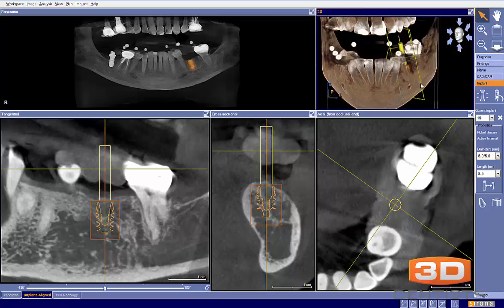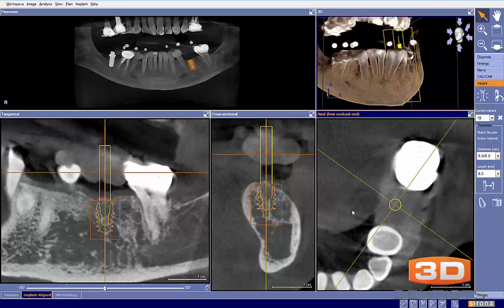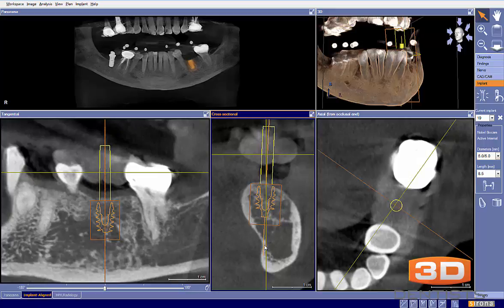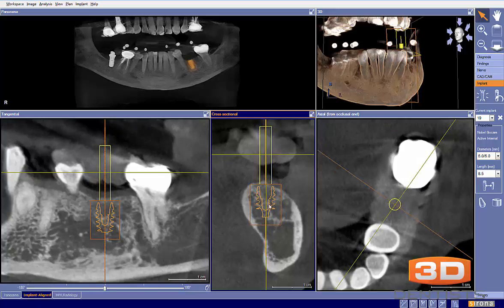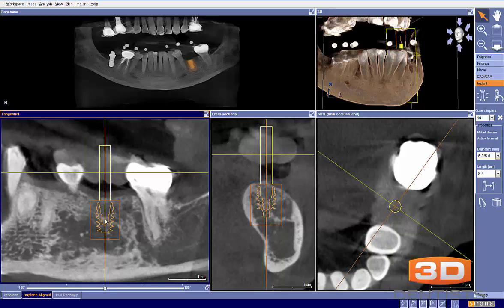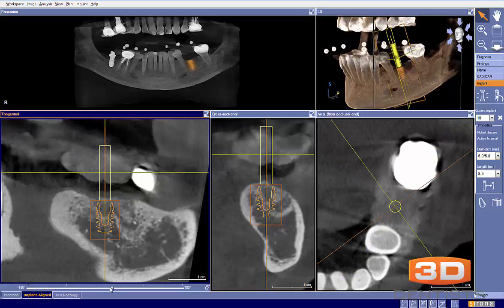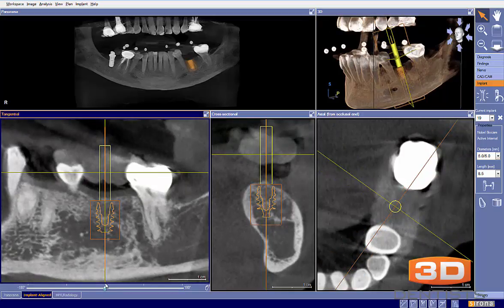I'm not sure that this is the exact implant placement I need. I don't have the benefit of our CEREC data yet. So my guess would be that this implant probably needs to be placed a little bit more like that, just from trying to center it there. I know that I'm off occlusal plane here, but we're doing that because I want to make sure that we don't create any hygiene food traps in this particular situation. So my guess would be something like this. Very safe in this situation of not worrying about hitting the nerve.